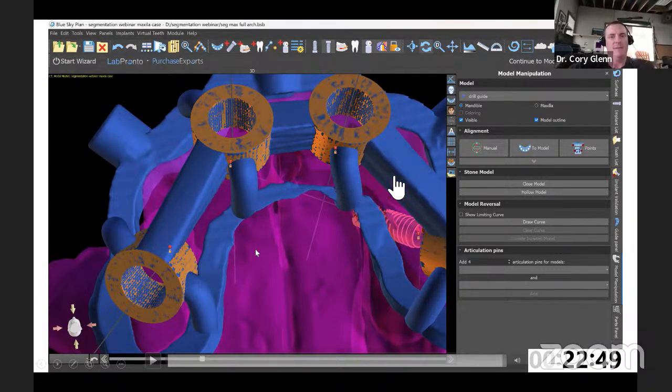22.5 minutes. I mean, that's not a long time to treatment plan a case that you're probably making $20,000 on. And it's going to make it go smoother. It will be more accurate. And you can have your prosthetics made ahead of time because you know where the implants are going to end up. So it should cut down on your conversion time by a ton. Should at least cut that in half.